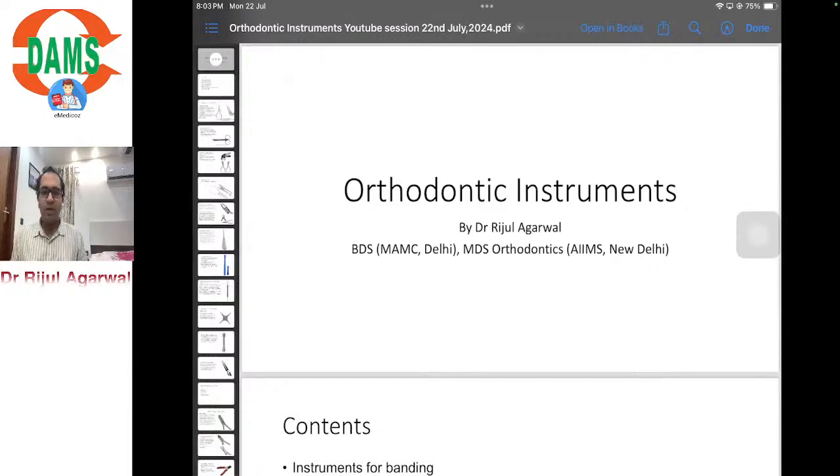So today we'll be taking up the topic of orthodontic instruments. It will be mostly image based only. In each exam, be it NEET or INI, one image comes from this part, identification, and second its usage. So I have summarized all orthodontic instruments today in my presentation. Hope it will be fruitful and informative for you all. So we'll just start now.